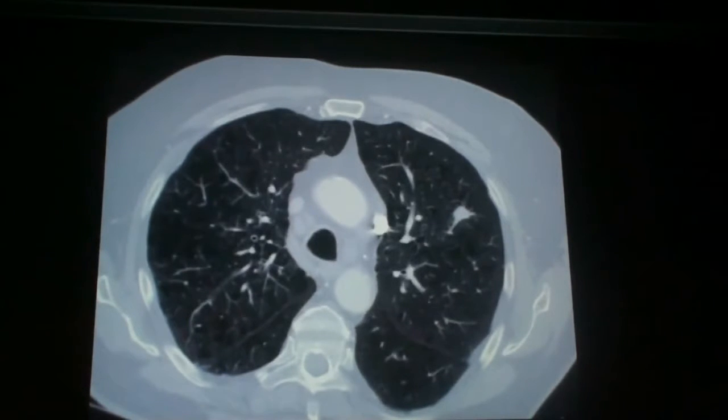Okay, I will leave this image for you. I need you to find 3 different abnormalities. So, what do you suggest? Left side SVC. Correct. There is a left SVC here.